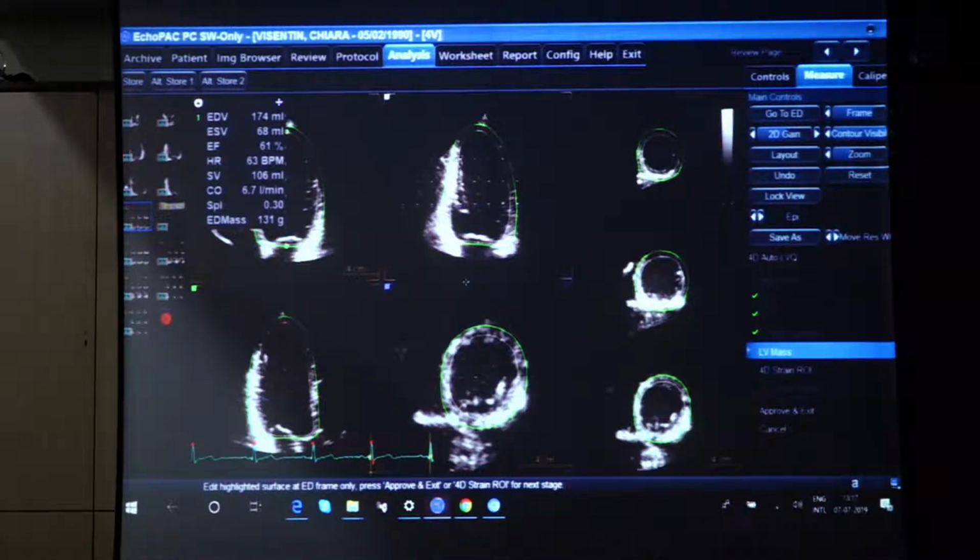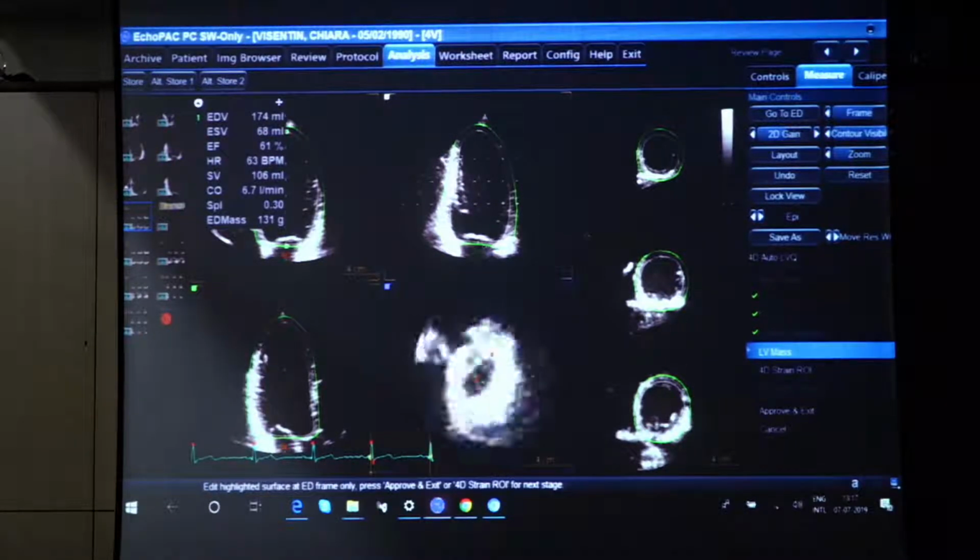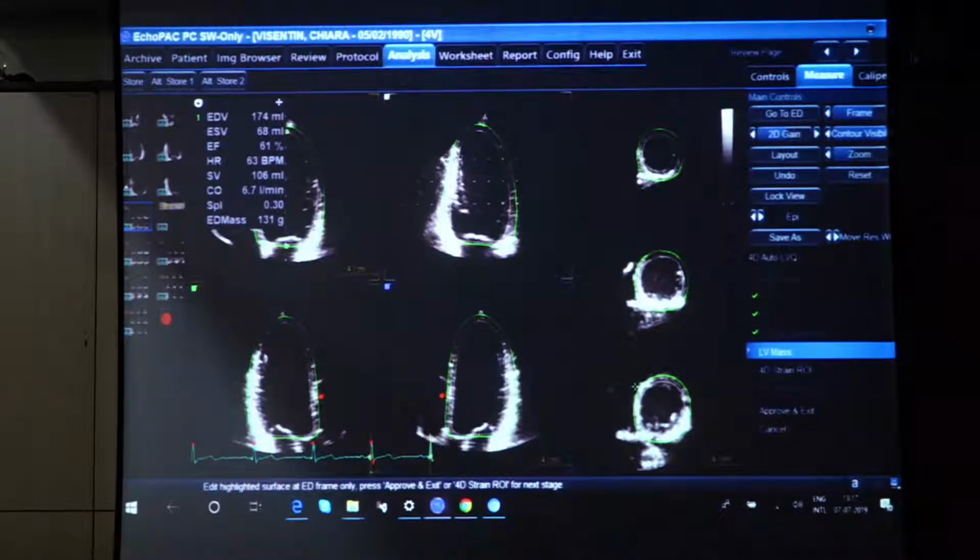You see here that you have two lines: the endocardium that is gray, that cannot be changed because it's the one that we have optimized before, and the epicardium that is green, that we can edit in the usual way. If we would like to have it larger or narrower, just put the green cross where you want to see it, and then click with the left button, and all the mesh will be updated.